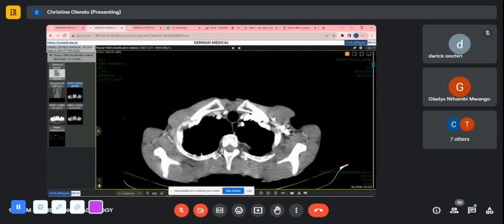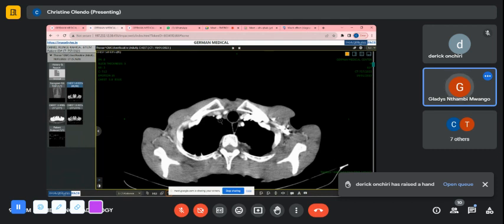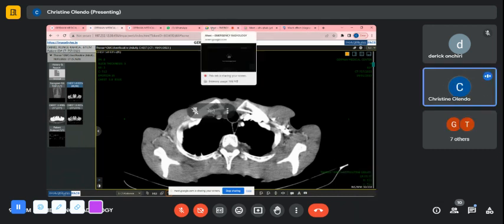Yeah. Okay. Because remember, when you're doing measurement, you do get averaging, yeah? But you can also look at how it looks on a coronal and things like that. Yeah, and I think one can feel confident in that you're not seeing anything enhancing, because if it's a met or something else going on, it should have enhanced. Yes. Okay. All right. Thank you, Doc.